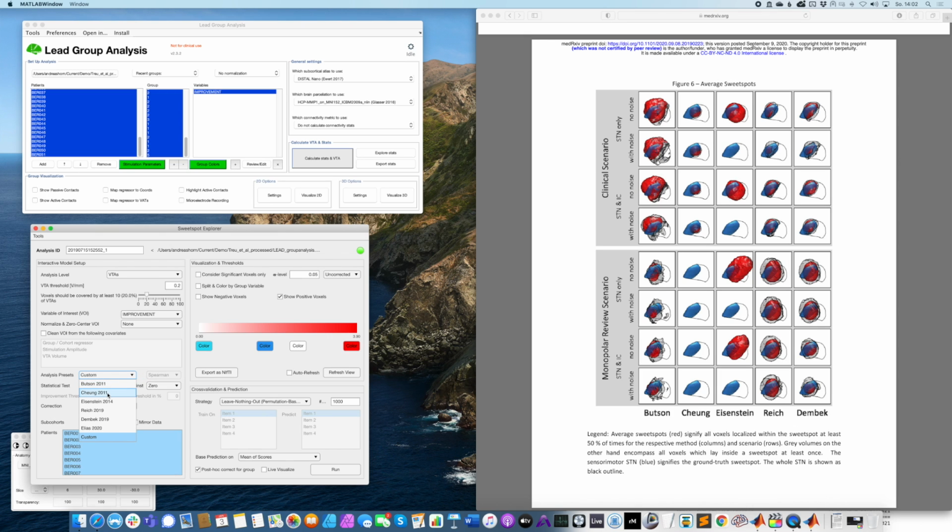But these presets might help you to get a specific idea. However, it should be said that these approaches, and there will be a warning window in the beginning of the tool, parts of them have used very different methods, so only the main ideas are captured here.